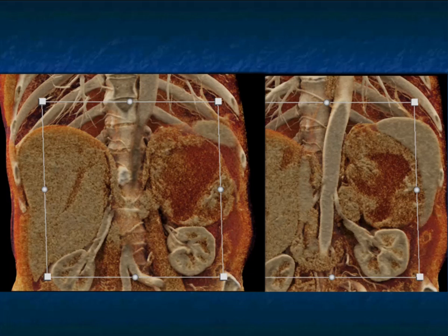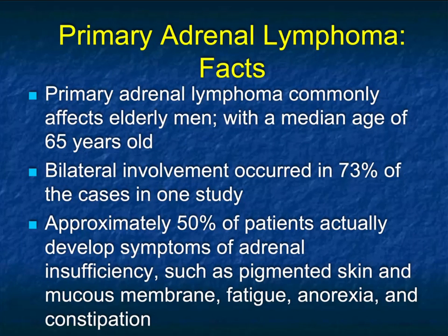That could be a good sign. It could be a good sign after therapy to show maybe the tumor is shrinking or becoming more necrotic, or a presentation showing you that it's a very, very necrotic tumor.